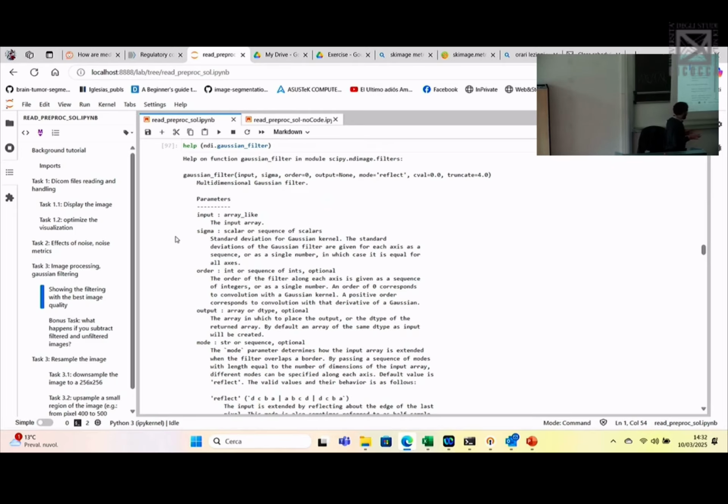Specifically, you can see the sigma of a Gaussian as the size of the object that will be preserved. If you have something much smaller than this sigma, it will not be seen anymore in the image, while if you have something much larger, it will remain basically untouched.